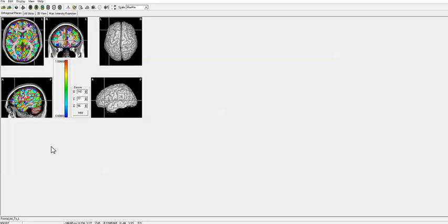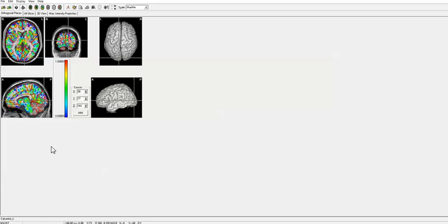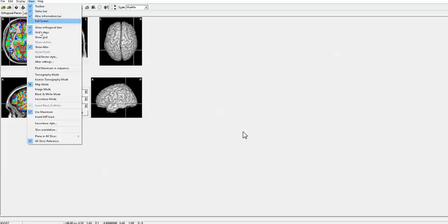We can take movies of the changes in contour, the values in the contours, for example, z-scores or the currents, at different points in time for the time domain LORETA, and we use also what's called swLORETA. That is a weighted standardized LORETA that Ernesto has developed. Now those are all contours you can see of the Brodmann areas at different views. Contours, there's little red lines around there.